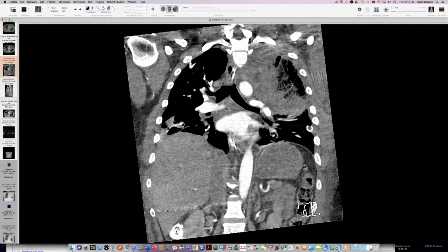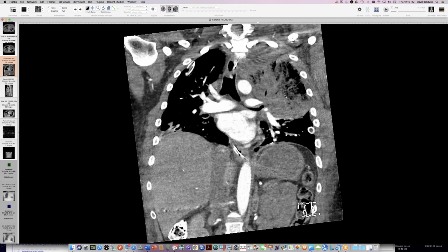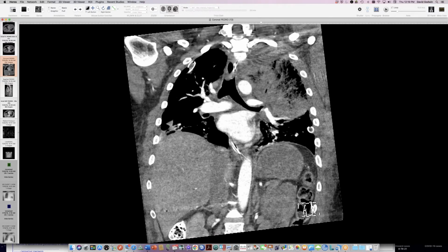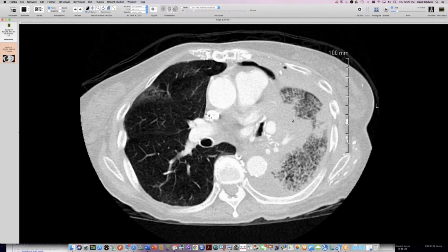I don't know what caused the left upper lobe to rotate like this, but this was verified at reoperation, where they removed this necrotic infarcted left upper lobe. They said it was a 180-degree torsion in a clockwise direction. So, left upper lobe torsion following thoracotomy. This is one of the few cases where I've actually been able to see the beaking and things like that. Most cases that are labeled as torsion are sort of disappointing in the imaging, at least around here. You guys have shown nicer things.